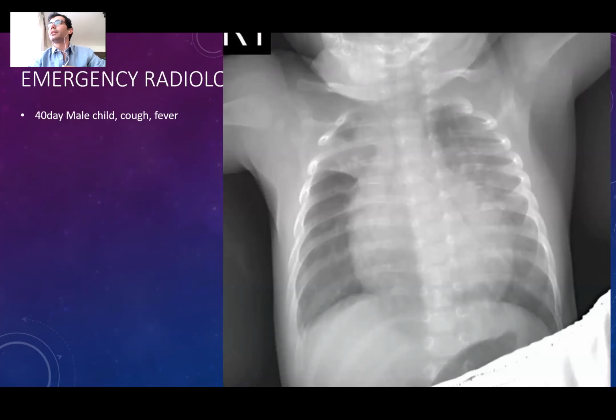So you order the chest X-ray, and they come back to you in 10 minutes with a chest X-ray in hand. Does anybody want to have a word about this chest X-ray? Hocam kardiyomegali var gibi. Cardiomegaly, somebody said. What else? The lungs look a bit grayish. Grayish on which side? On the right side, so the patient's left side.